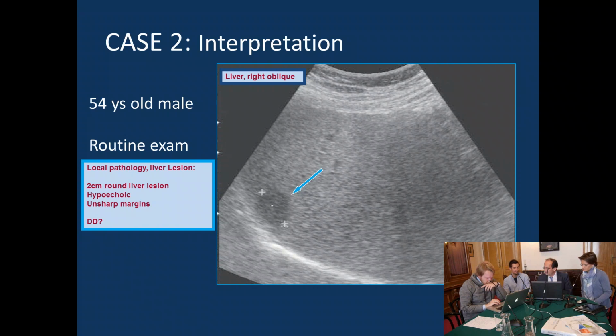What do you think? There is one differential diagnosis missing. You want me to give the answer? No, the chat. You know it. Maybe you don't know what I mean now, as I wouldn't know if you didn't tell me the question. But we had metastases. Is this the only malignant lesion? Suggestion: it might be a primary liver tumor. Yeah. Which one? Nobody knows, of course. Suggestions?